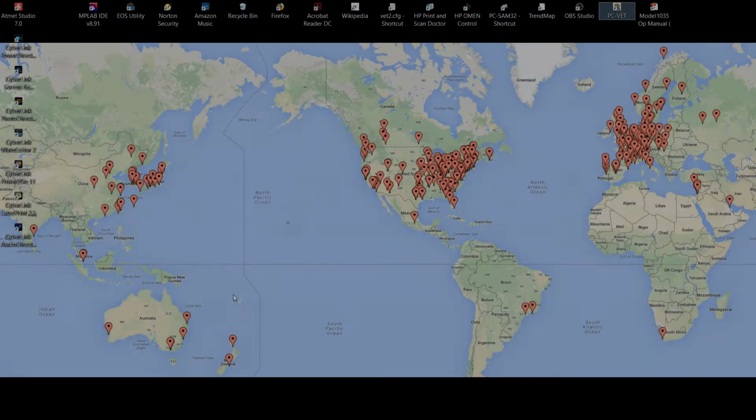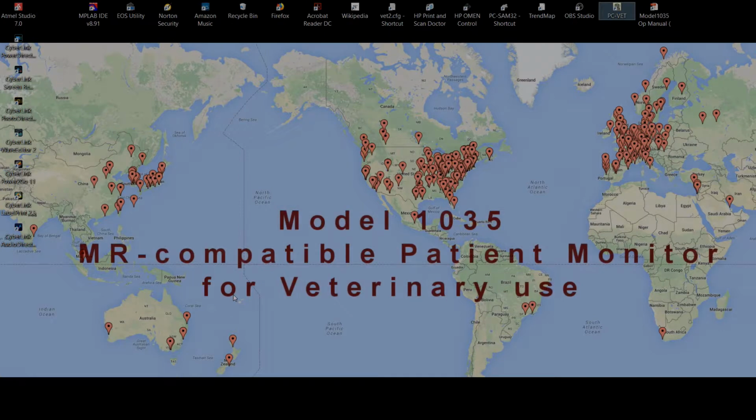In this video, we present an overview of PCVet software. PCVet software is the user interface for the Model 1035 MR-compatible veterinary monitoring system.